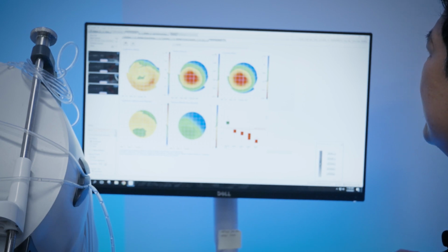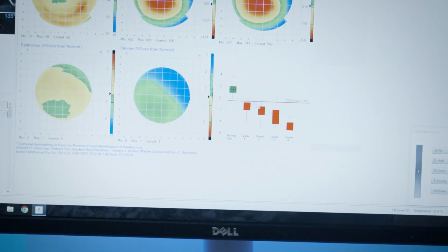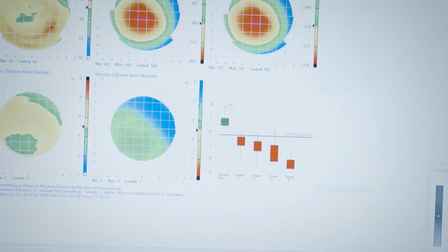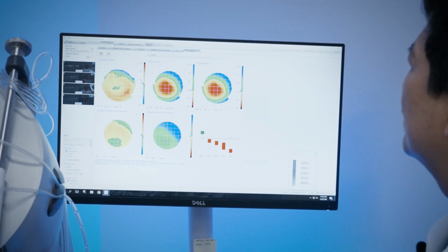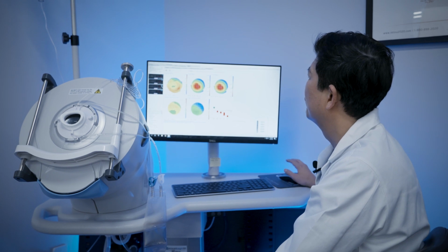And then finally, this here is the RSK, the risk score, is below normal here. It just tells you that the average person in the database should be in this area with this standard deviation. This patient falls in this area. And this is just looking at a bunch of different epithelial mappings and comparing it to a database. So this gives us a little bit additional information.